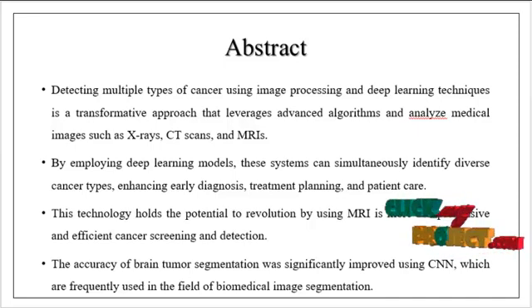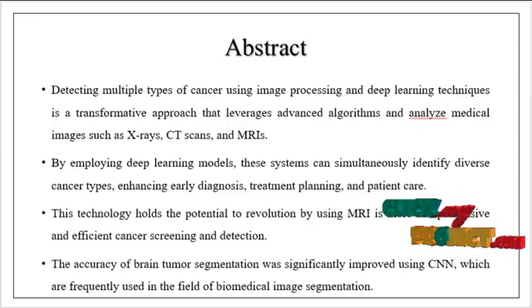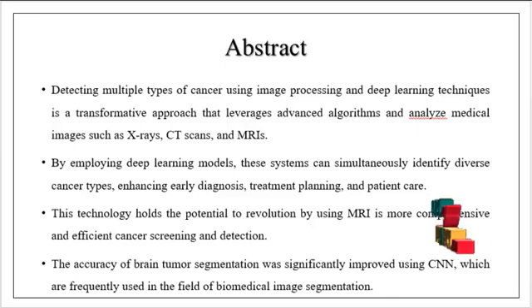So the user can select any image, like a cancer image or a non-cancerous image. The system model can predict accurately whether it is cancerous or not. So we have to justify the classification process by means of the accuracy and the error rate. In case the accuracy is high, in the sense the performance of the classification is high.